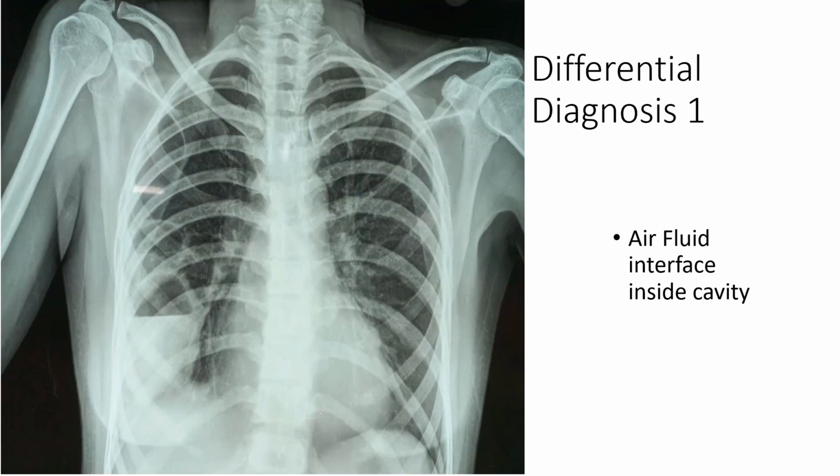Now comes the interesting thing. I said last time that the line should go through and through from lateral to medial. A complete lung should be involved in hydropneumothorax because the entire pleura is involved. Now you are finding a line here, right? But it is not through and through. If you look carefully, you can see a sort of margin here, and here also there is something round.